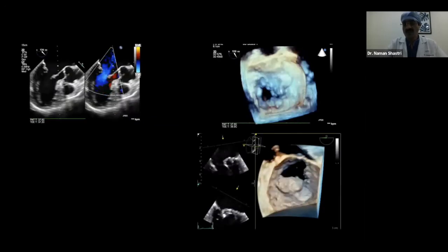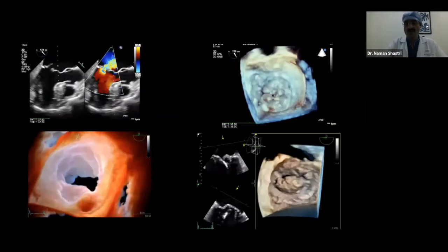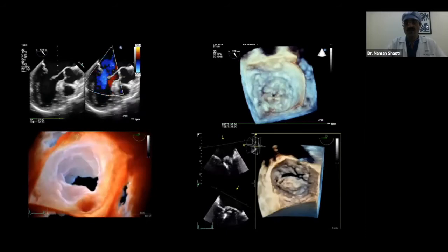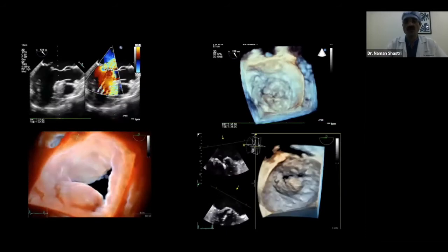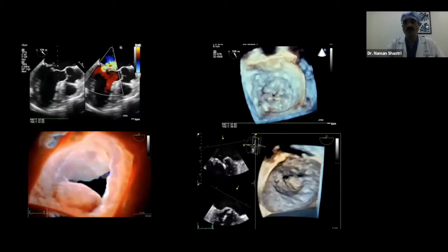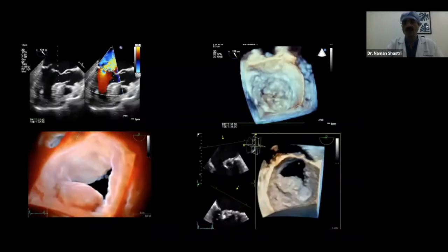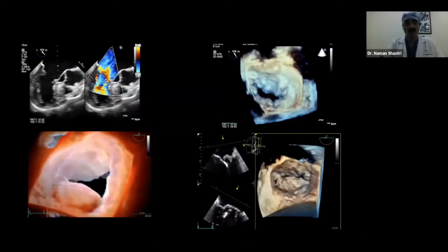But if you get some type of case where it is not bileaflet prolapse, but you can see that the P2 segment is bulging out, which looks myxomatous, though the rest of the segments never look myxomatous, what could be the reason? Because fibroelastic disease, when it comes after a long time, over a period of time, these prolapsing segments look myxomatous somehow.